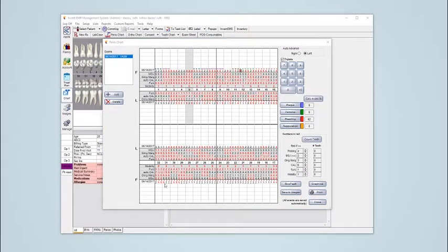Okay, now let's talk about the index. If you click on calculate index, it will do some sort of an algorithm to give me the percentage of, for example, the bleeding. In a typical scenario, each tooth will have 6 sides, and if we have 32 teeth, then we're talking about 192 sides, and if we have 19 or 20 sides with bleeding, then the percentage will be 10%. In this case, according to this random reading, we have 62% for the bleeding.